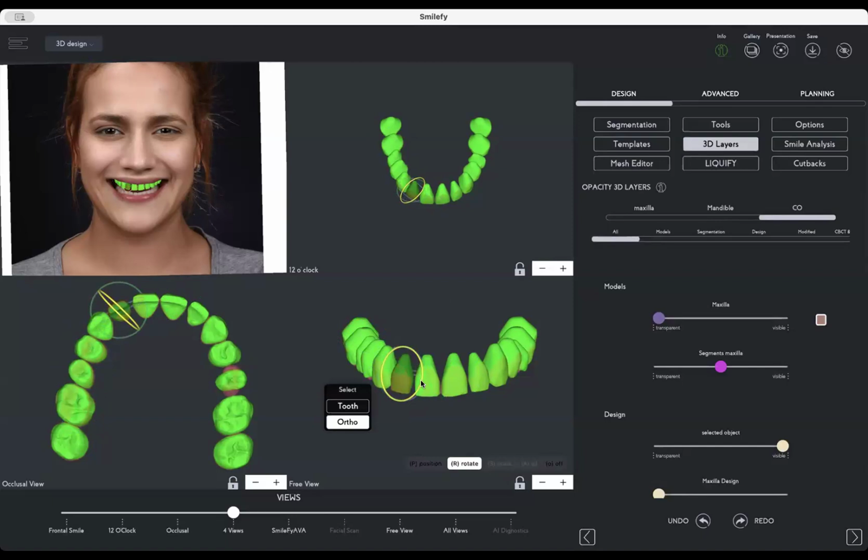design. So we can even move this lateral a little bit in, this canine a little bit in, mesial. Oh, this premolar, not ideal. So we move it here.